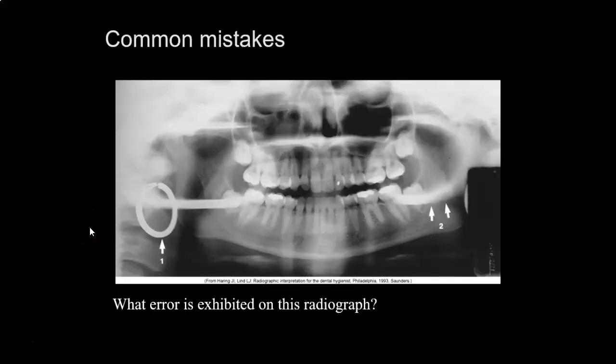Common technical errors. So now it's your turn. I'm going to give a little pause in between each one so that you can take a minute to try and guess what the error is on the film. Okay, so common mistakes. What error is exhibited in this radiograph?